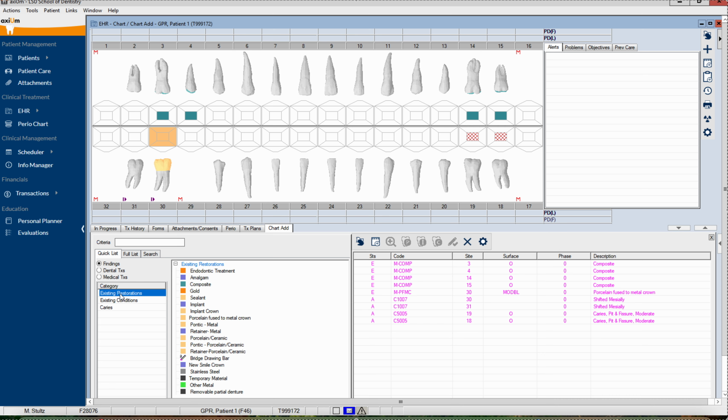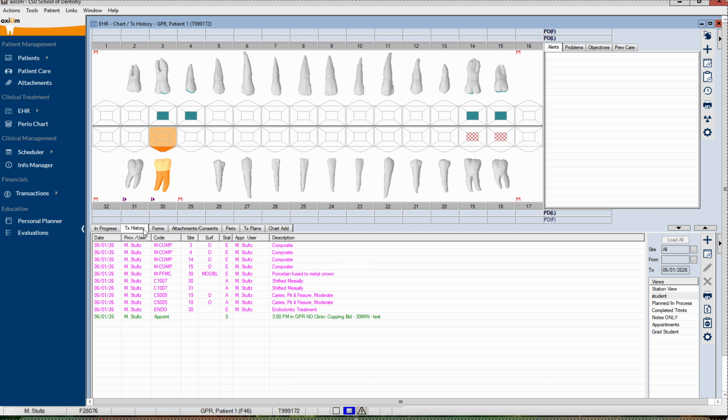All right, so we've gone through just from the Panorex and the odontogram, updating as much as we can. So marking things missing, marking previous restorations. Let's say they've had a root canal there. Okay, and it color codes everything, and this makes it great so you can just glance at it and generally have an idea of what's going on. After this, you can go to the treatment history and say, look, all these pinks are in the findings, okay?